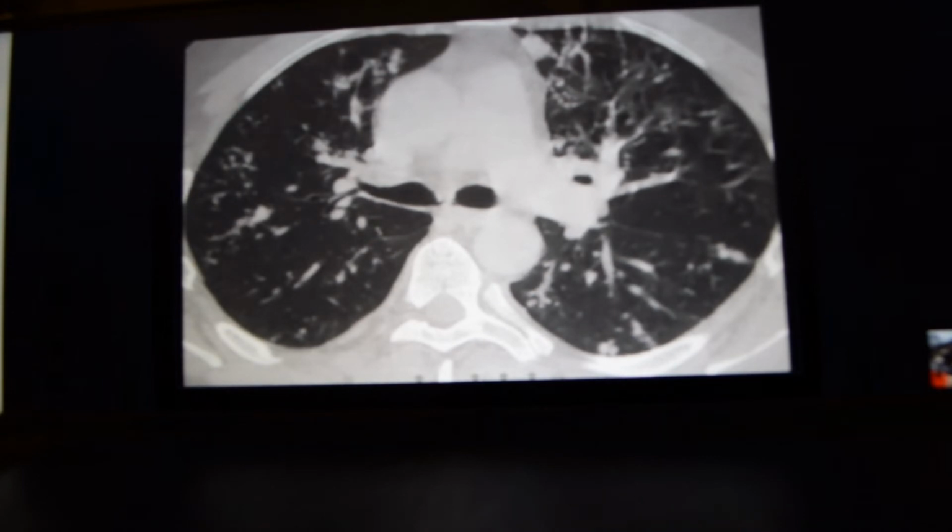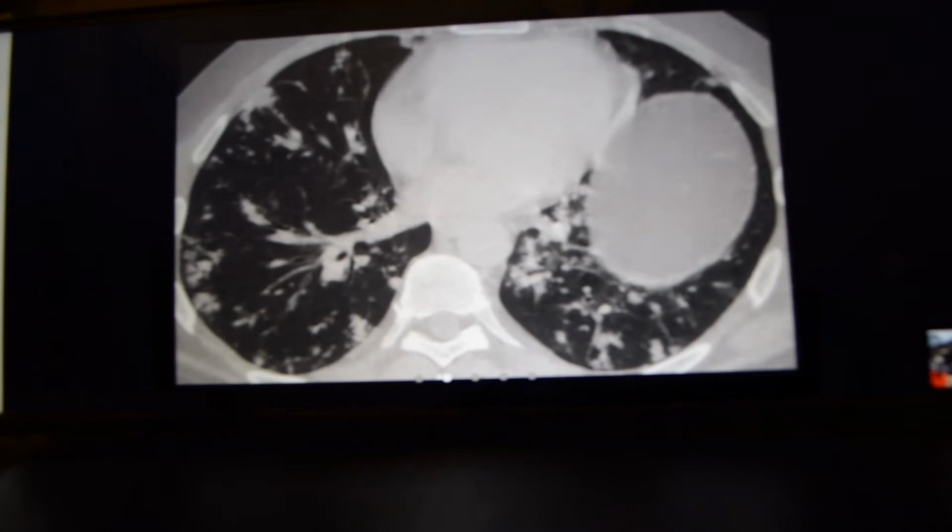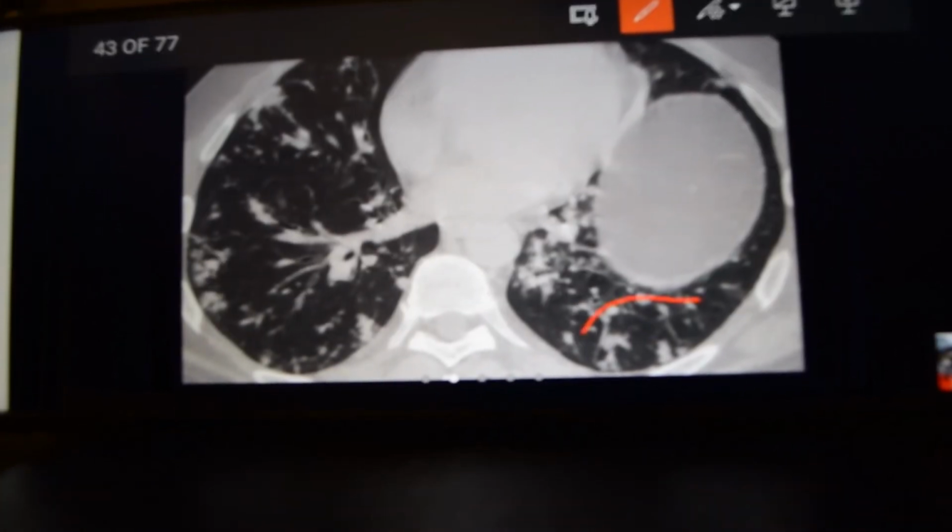These are subpleural nodules, and as we know, subpleural nodules are a feature of perilymphatic nodules, which may be due to lymphangitic carcinomatosis or silicosis. Again, perilymphatic nodules, subpleural, with thickened interlobular septa or interlobular fissures, and this is also a feature of silicosis, sarcoidosis, and most likely lymphangitis carcinomatosis.